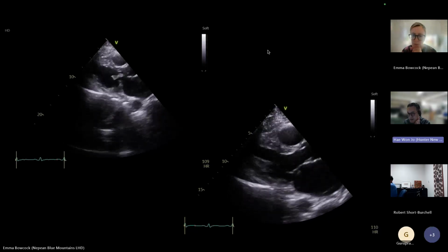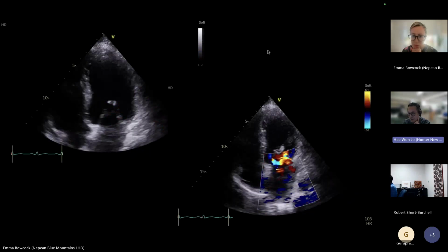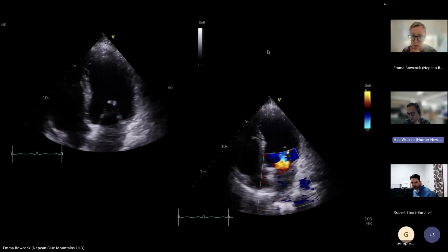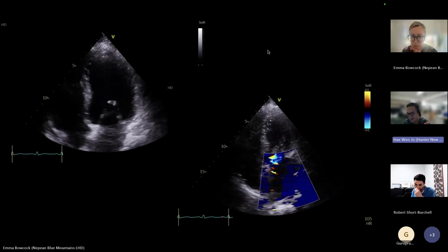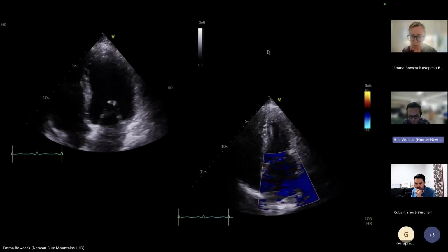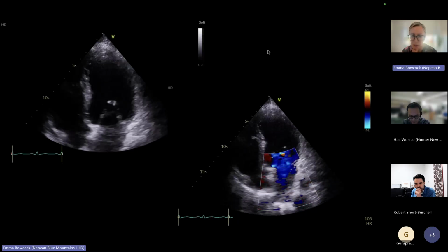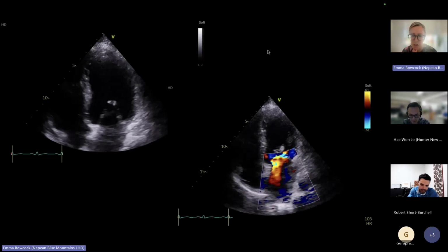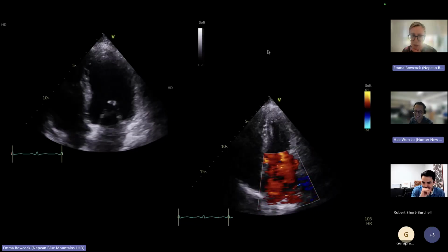Tumors, I think probably less likely. And the mitral valve, again, I think it's very less likely here. And then artifact, which clearly this isn't. Yeah, nice. You mentioned thrombus there as well. Yeah, I should have. Yeah, thrombus, tumor, thrombus, I think, yeah.